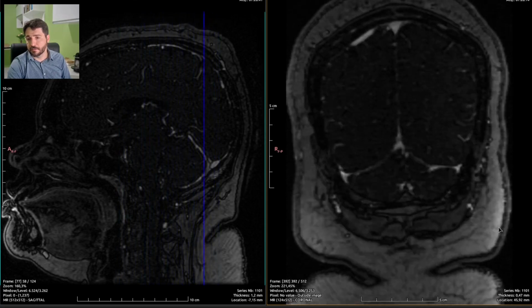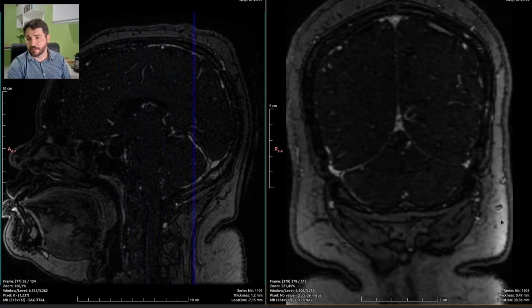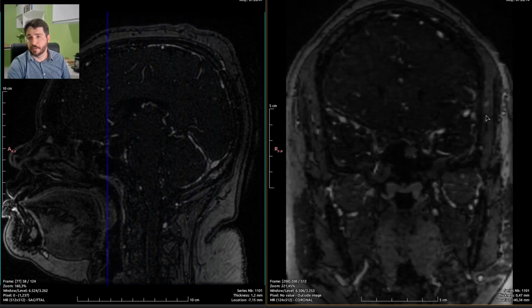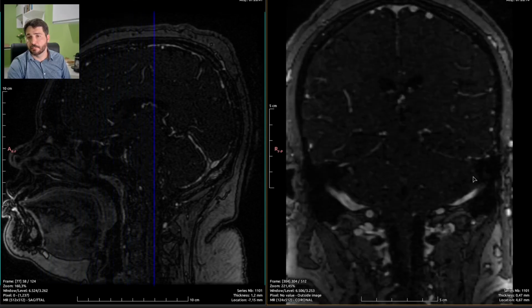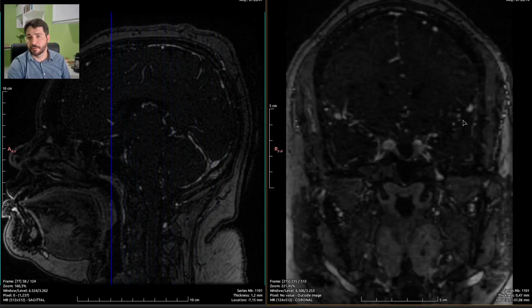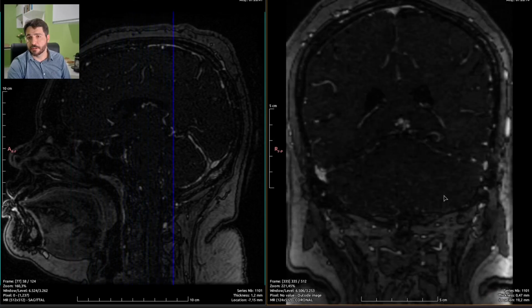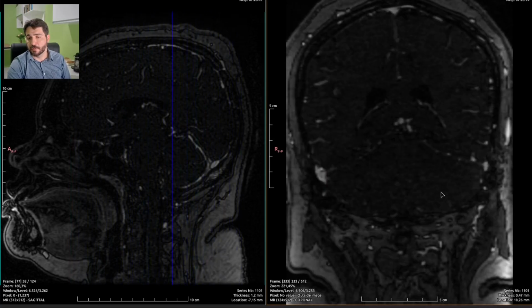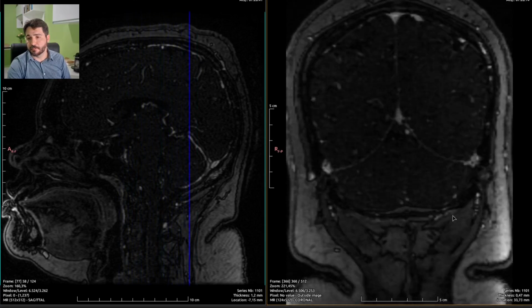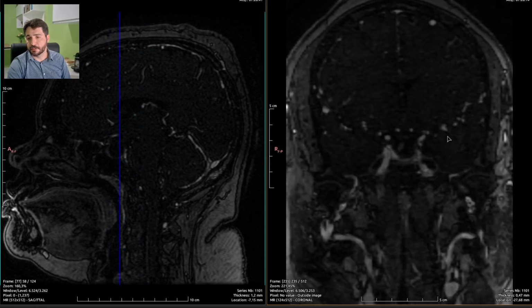It's always good to check vascular pathologies in more than one plane, because sometimes we just miss an important feature, or we miss an acute thrombosis altogether because we didn't care to check on more than one plane of view. As we can easily do MPR reconstruction, why not?